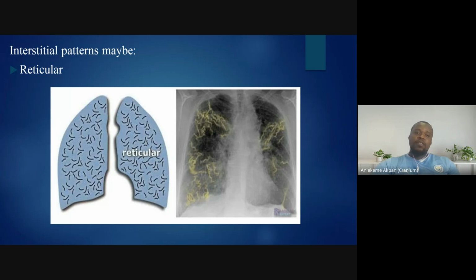Yes, but it also depends on the disease. If it is tuberculosis, because tuberculosis affects the interstitium and also affects the alveoli as well, so definitely the person will cough with tuberculosis.